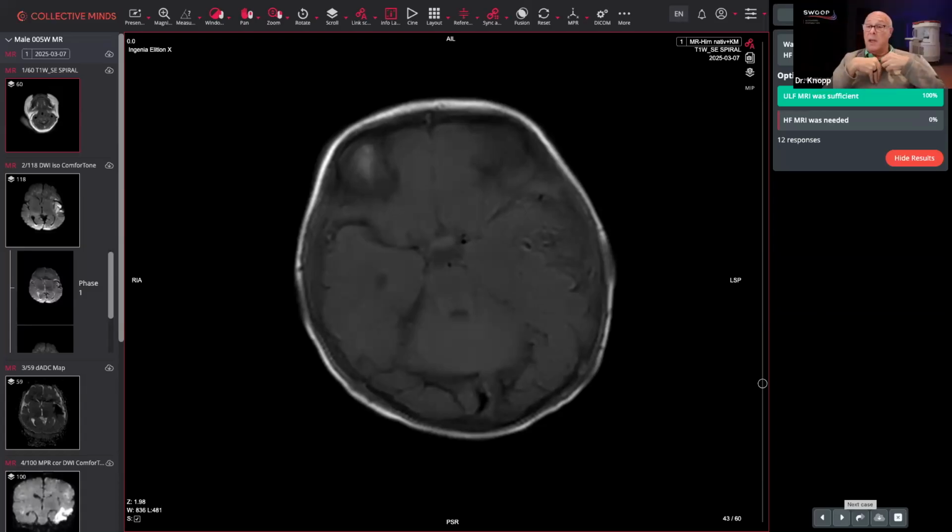So from a radiologic standpoint, given everything we've seen on the image, the evidence of location of this hemorrhage at the interface of the brain and the inferior skull, it's clearly consistent with the contusion in my mind. In addition, we saw scalp soft tissue swelling that looked like it was in the opposite location. So now we're dealing with what we call coup and contrecoup injuries. In my mind, this is absolutely positively consistent with traumatic contusion.